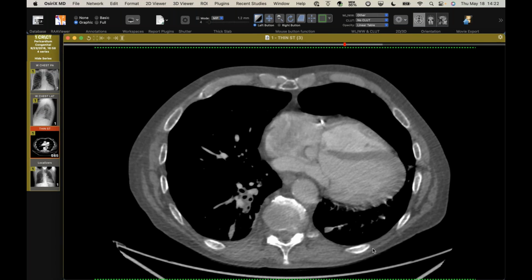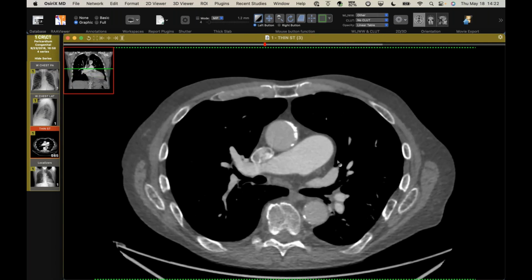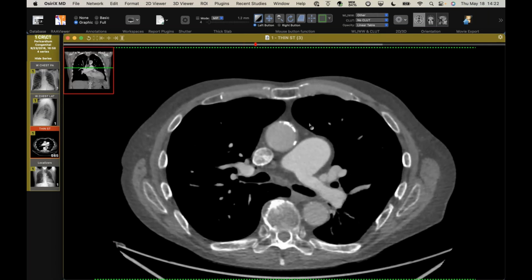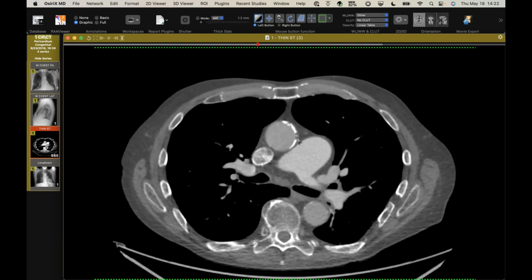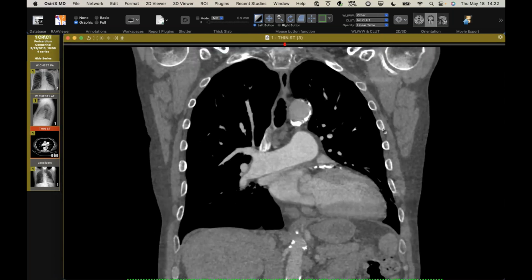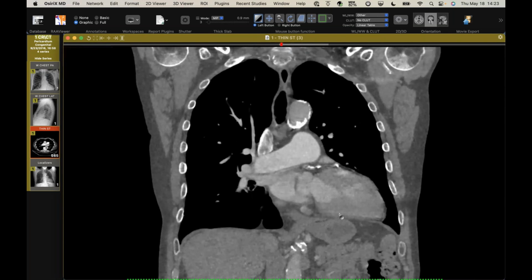It can mimic a lobectomy, but in this case, it was just partial, and the left lung just kind of hung out around it. I'll put it up on the coronal. Let me go up higher. There's that neat little finding right in here. Sometimes you'll see a little bit of lung come in between this recess where there's no pericardium, but in this patient, we don't see that, and I think it's because there's just a lot of mediastinal fat. But I'll put up the coronal here, and sometimes you'll see the lung underneath that can sneak in there as well. So, partial absence of the pericardium.